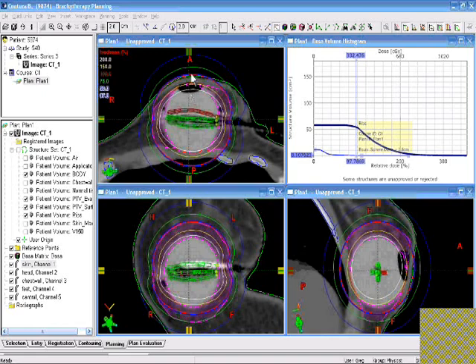But we don't really have as much information about that as we do for the skin. But you can see that the optimization that we've done in this particular case is a reasonable optimization. An individual physician, and especially an individual physician with knowledge of the particular sensitivities of the patient in front of him, may make different choices, and that's entirely legitimate.